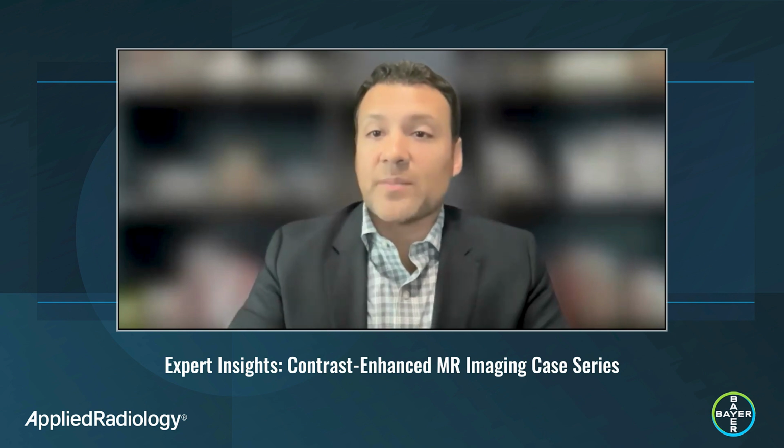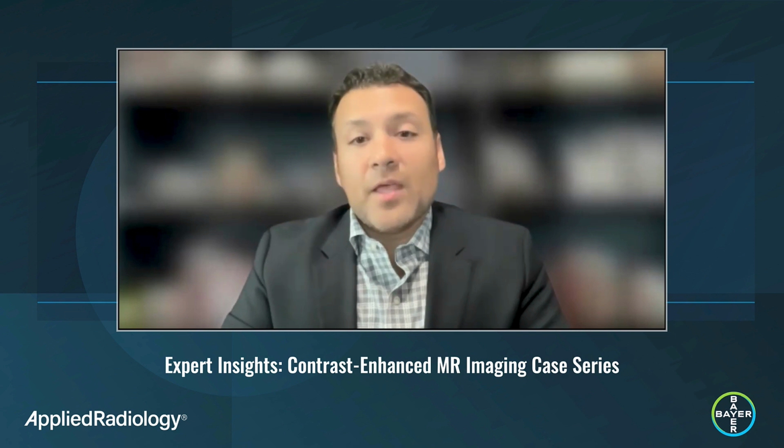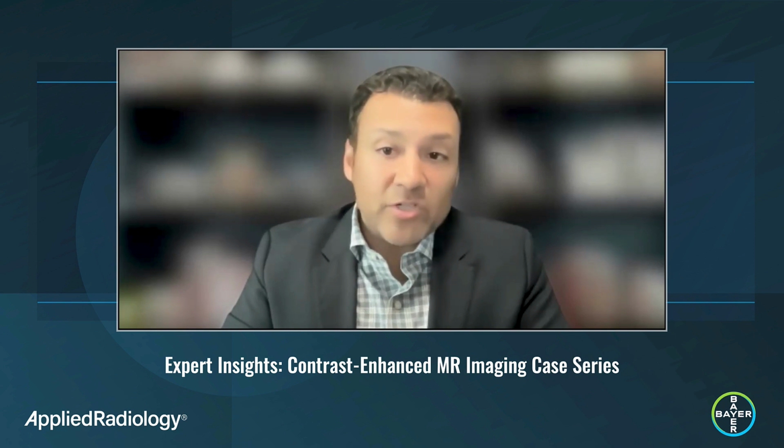Today, I'm going to show you examples of cases of how I've used EOVIST to image our patients. EOVIST is the first and only FDA-approved hepatobiliary-specific contrast agent for liver MRI. It combines dynamic and functional imaging information for comprehensive liver imaging, which can be done in under 30 minutes.